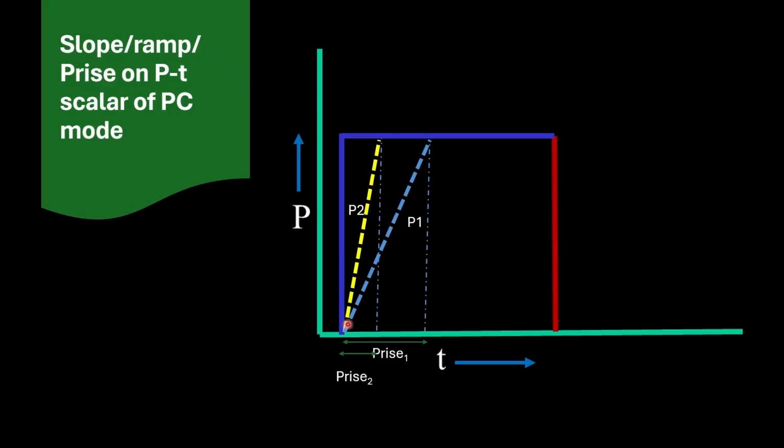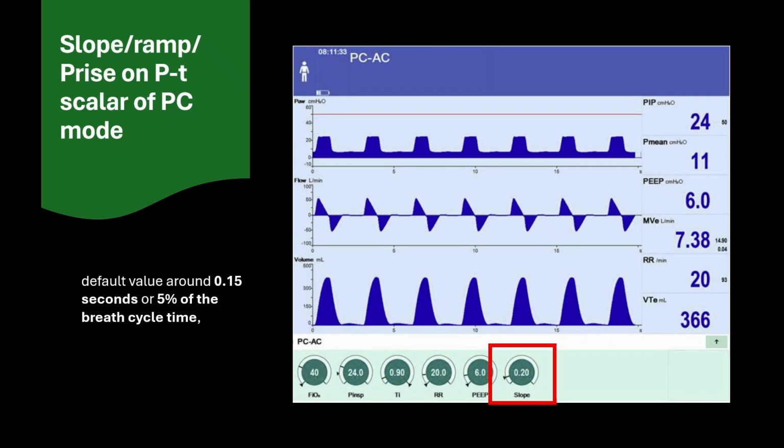This can be manipulated in the ventilator settings. So what is the normal P rise? 0 to 400 milliseconds is the normal P rise, and we usually select 150 to 200 milliseconds, or 0.15 to 0.20 seconds. A shorter P rise is for patients who want more flow. At the same time, the patient will feel an air blast during inspiration because the pressure rise will be very fast.